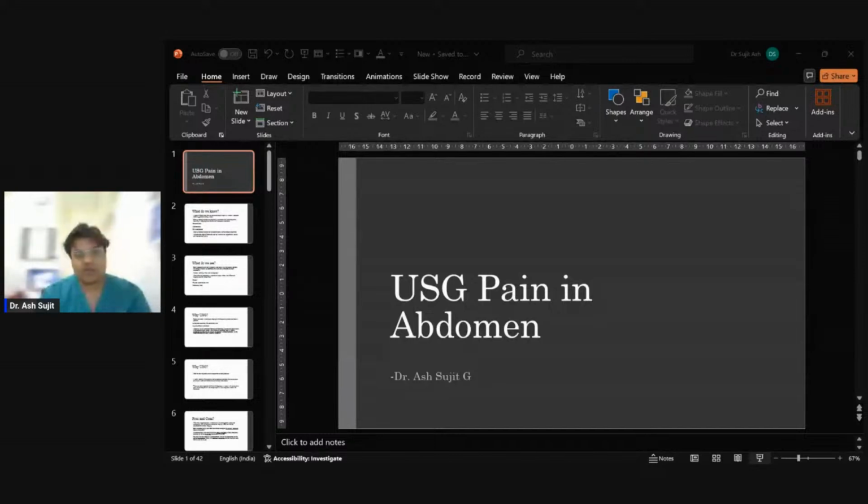The sonographic appearance of a hemorrhagic cyst is complex and variable, depending upon how much the bleeding is and at what stage of bleeding we are when we look at the cyst. The appearance will slowly evolve over time, reflecting gradual change from acute blood to subacute blood to clot formation and finally clot retraction. There is acute bleeding that happens. After a while, this might settle and lead to subacute blood, which you might see as debris inside. Then it will form into a clot, and eventually the clot will start reducing. That is clot retraction.